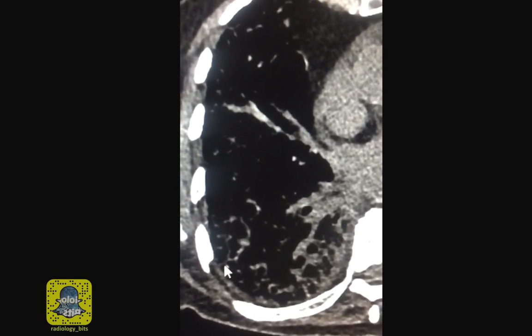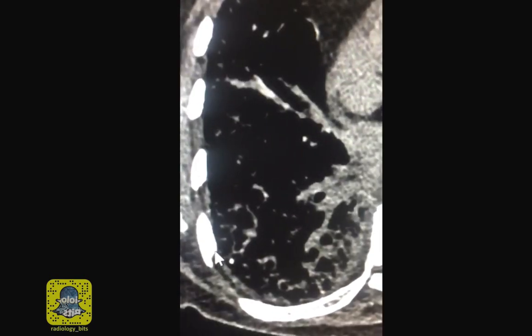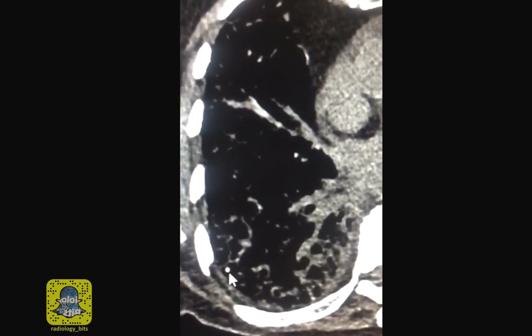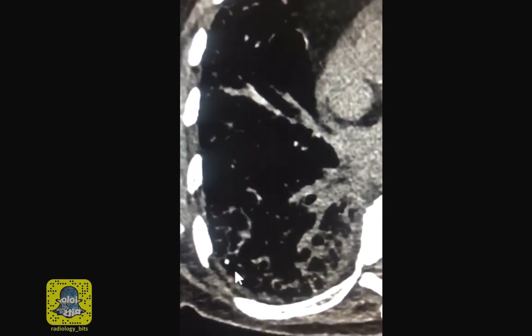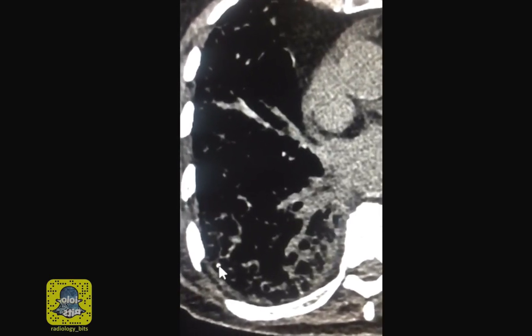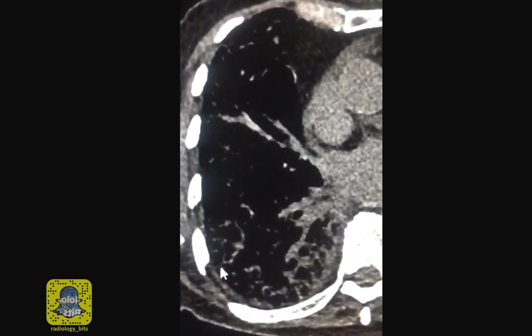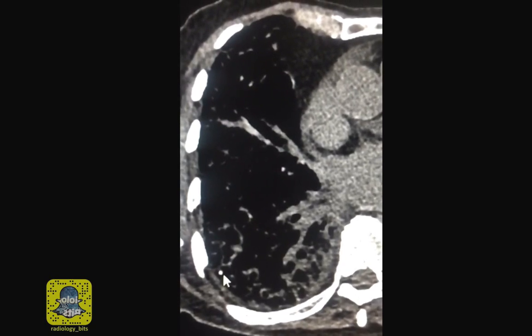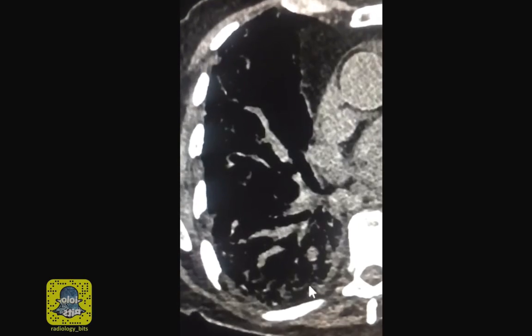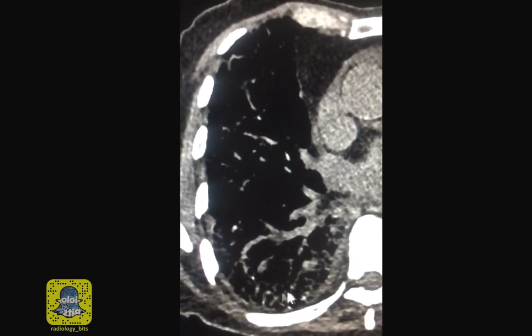Pathologically speaking, the difference between a granuloma and ossification is that ossification is real bone. If you resect this area out of the lung, the pathologist would tell you that this has a cortex and a marrow, exactly like normal bone. This is in comparison to a granuloma, which is just a collection of abnormal calcium within an unusual location. So what we call pulmonary ossification could be idiopathic or primary, and could be secondary to an insult. What we're looking at here is a secondary type, and that's related to a long-standing insult, which is fibrosis in this case.